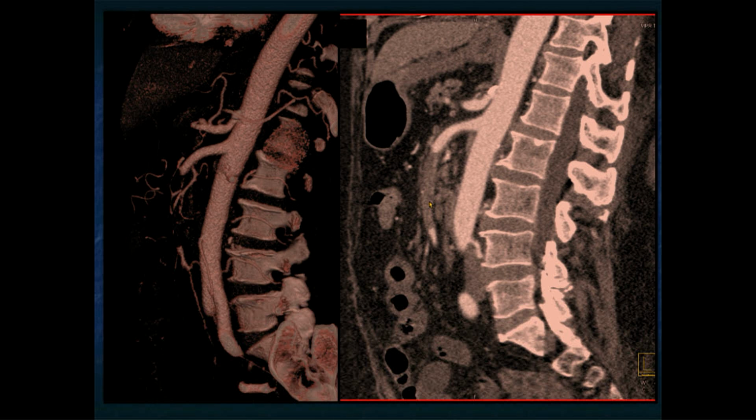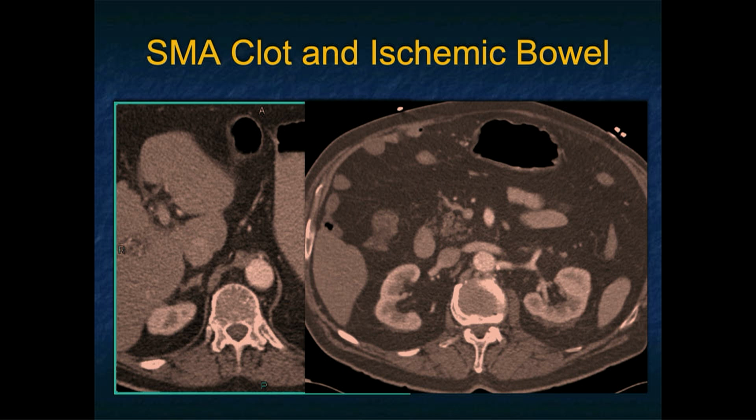Now, I don't do legal cases, but I have to admit I've looked at a number of cases for MedChi of Maryland, and this is a typical example. This was one of the cases. This was a patient who came in with abdominal pain, and this study was read as negative. If you look very quickly, the upper abdomen, everything looks really good. And here's the SMA, and I'm only going to worry about the SMA. But the SMA looks great.